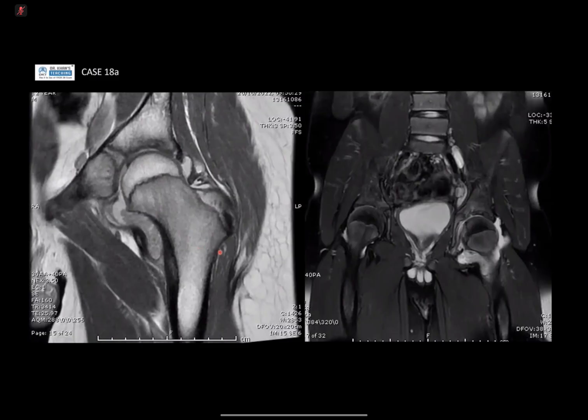Often in septic arthritis, there will be some extent of marrow edema, and of course, prolonging it without treatment, you start to get more in the way of bony destruction because of the inflammatory process. Now, a small thing. So, we do an MRI of the hip. We also look for other features. In this T2, there's irregularity of the chondral surface. It's probably just an incidental osteochondral lesion that's not associated with the underlying process.